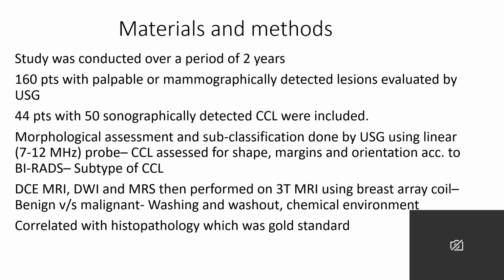Complex cystic lesions were assessed for shape, margin, and orientation according to Berg's subtype of complex cystic lesions. Dynamic contrast enhanced MRI, DWI, and MRS were then performed on a 3 Tesla MRI machine using breast array coils.